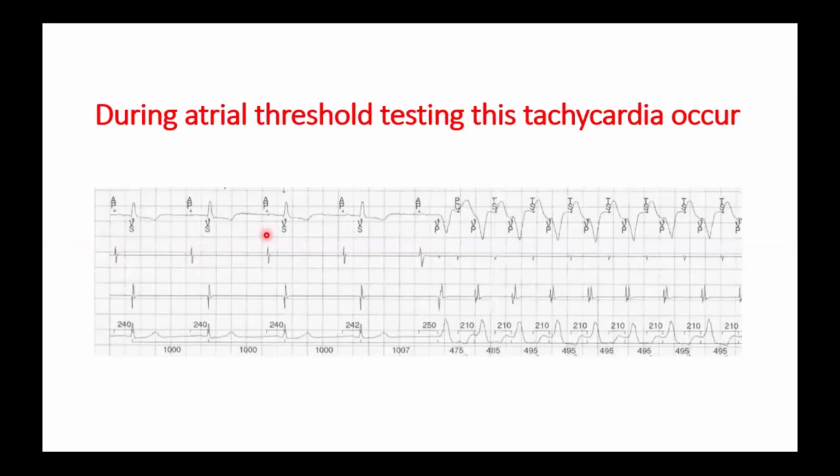Explain it, Rossasy, please. Okay. As we said before, when there is an intrinsic conduction, we should notice both the channels. So there is here an atrial pacing followed by ventricular sensing. Here atrial pacing, notice the ECG hump, which is the P wave, followed by ventricular sensing.